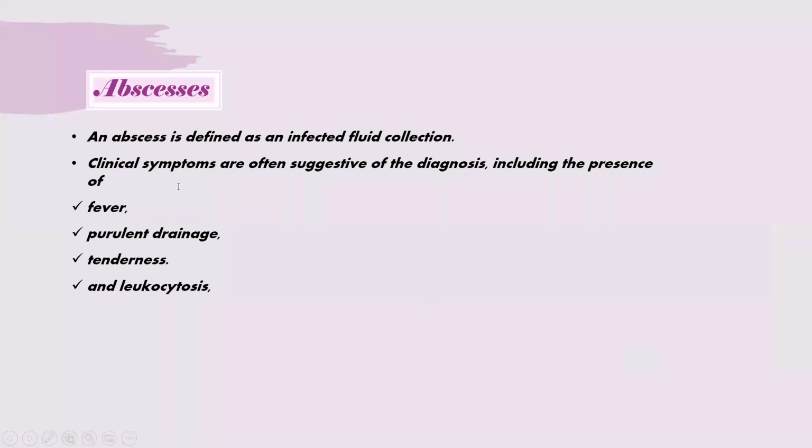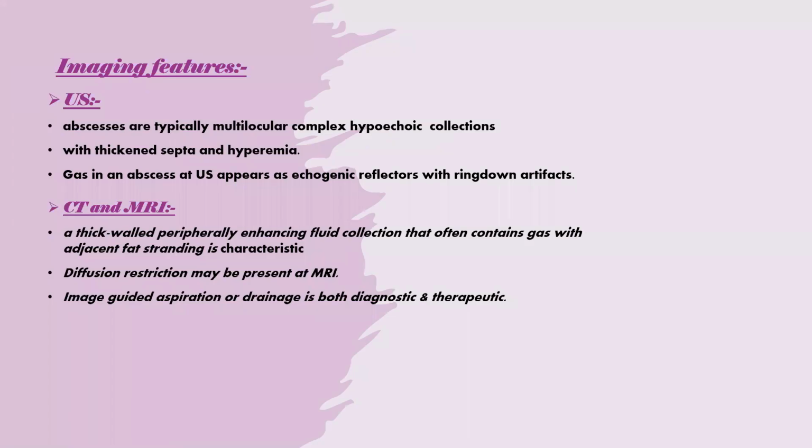Abscess is defined as an infected fluid collection. Clinical symptoms are often suggestive of the diagnosis, including the presence of fever, purulent drainage, tenderness, and leukocytosis. Imaging features of an abscess: ultrasound typically shows a multilocular, complex hypoechoic collection with thick septa and hyperemia.